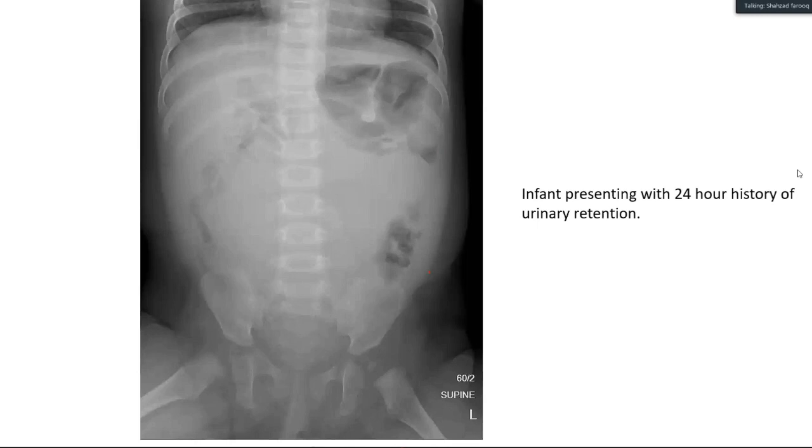Sir, CT scan. Right, now I wanted you to say that. Yes, I want. In our setup, we don't want to do CT scans straight up. You can always, sir, do an ultrasound correlation. So if you ask me which one is better, yes, for sure CT is better. But if you have an ultrasound, maybe this thing is not what you really think.